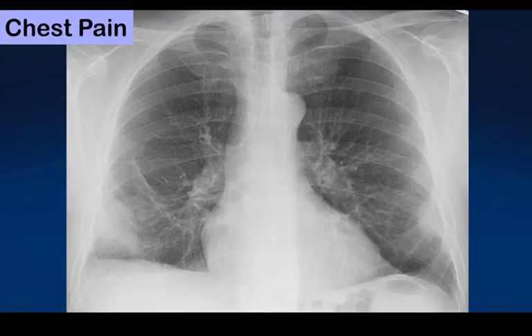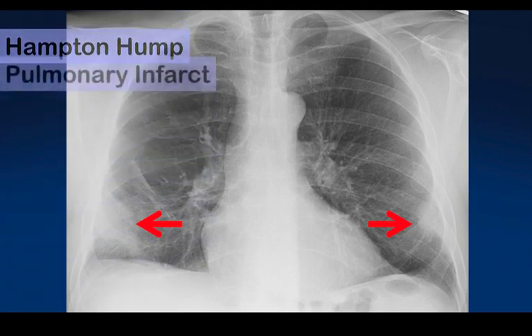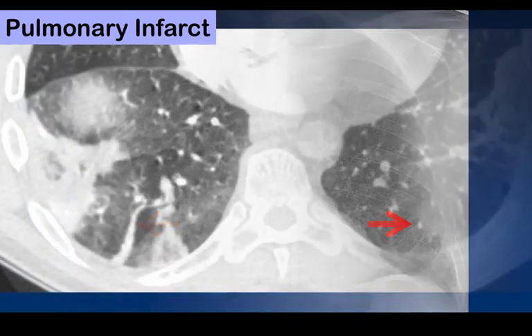Patient with chest pain, and this chest radiograph showing bilateral subpleural opacities, which are relatively well defined. They have broad bases against the pleural surface. They are roughly triangular or wedge-shaped, and these, of course, are very characteristic of so-called Hampton Hump, or in this case, Hampton Humps, which generally suggests the presence of pulmonary infarction due to pulmonary embolism.